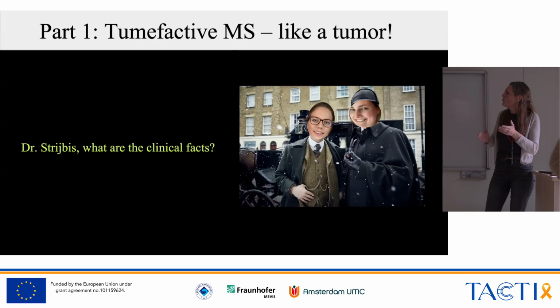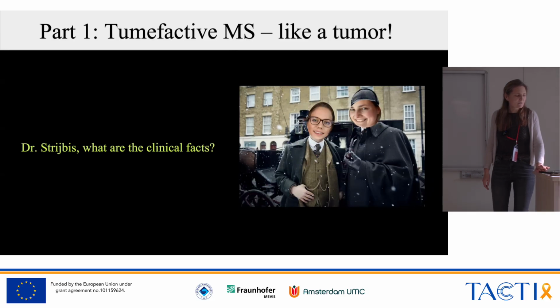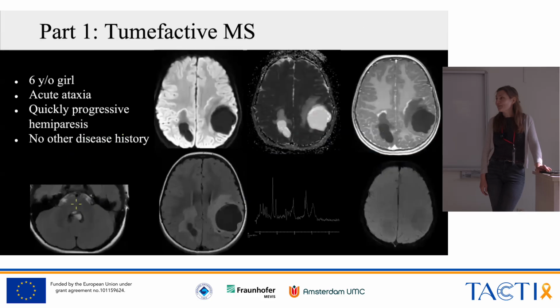And do we know why some have Charcot type MS and others develop this tumefactive type? No idea. No idea. Yeah, I also couldn't find anything that made a lot of sense when I dug into it. Thanks a lot. But this is what this tumefactive type looks like.